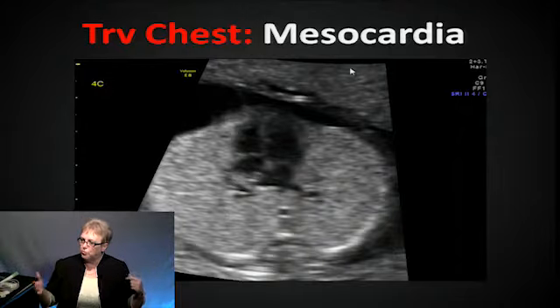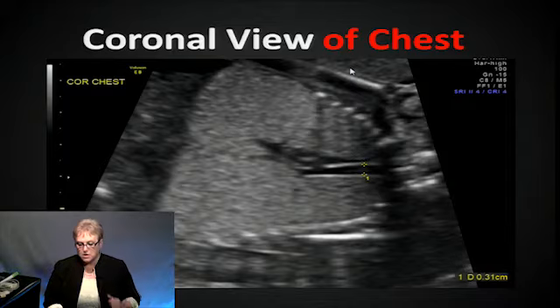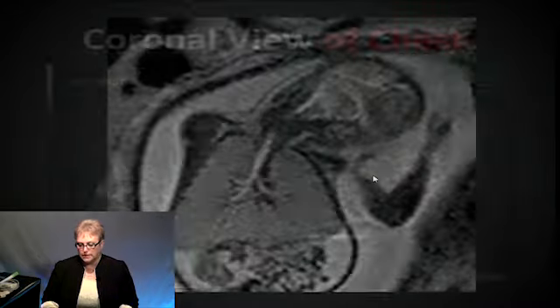So now we're seeing bright lungs, we're seeing some abdominal ascites, and we're seeing that the cardiac axis is right at midline. So looking at a coronal view of the chest, look at the diaphragm. What can we say about the diaphragm? Is that the normal way the diaphragm looks? No, it's inverted. So flattened or inverted diaphragm, and then looking here. That's the trachea. You should not be seeing the trachea dilated like that.